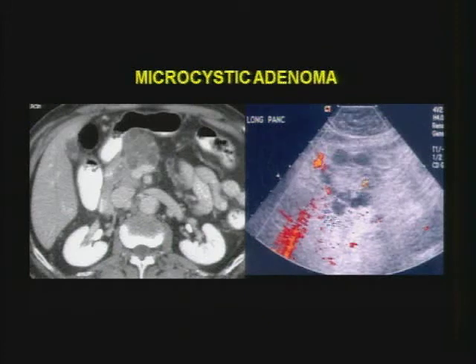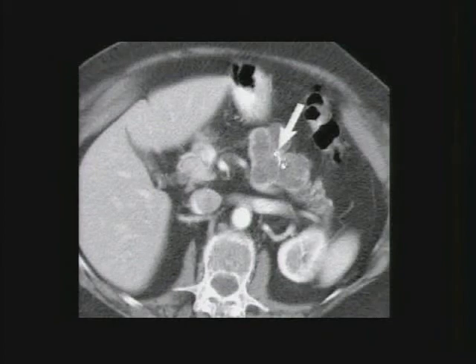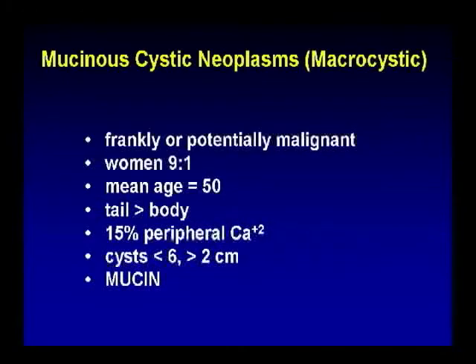And here it is on ultrasound. Here's a patient who couldn't have IV contrast, but again, you can see the multicystic nature of this. T2-weighted MR is also very good for diagnosis and demonstrates a cluster of small cysts. Now, this patient has the classic central calcification and scarring, but you can see that the cysts are a little bit larger, but they still measure about 2 centimeters. And when the cysts are very, very small and enhanced, you can see that it gives the lesion an almost semi-solid appearance. But look for this central stellate scar and the calcification.